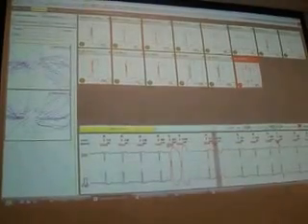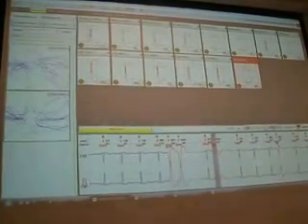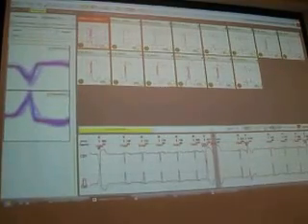I will show something interesting with these clusters, but before I do it, I set the correct type of the clusters.